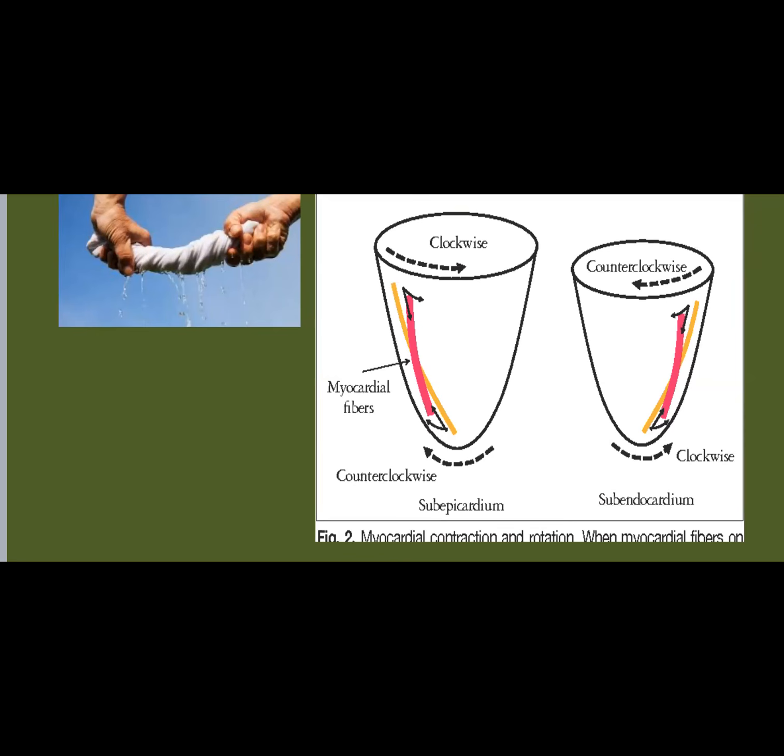So the apex and base twist in opposite directions, the same way as you are squeezing a wet towel, okay? This is called twist, or twisting strain. This is one of the strains. It's not all. Strains are so many. This is one of them.